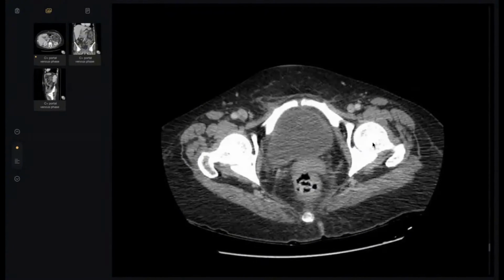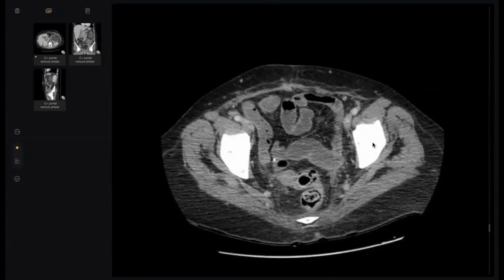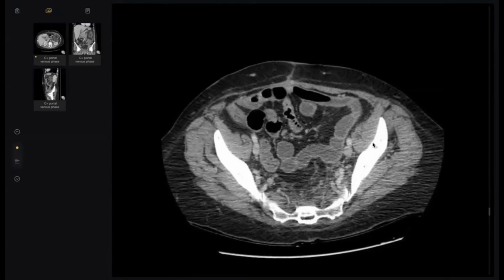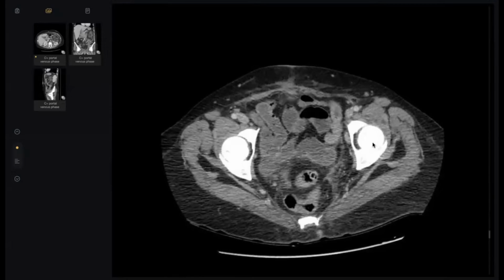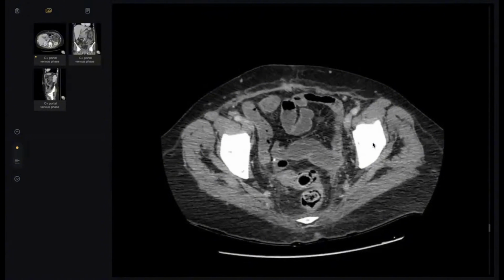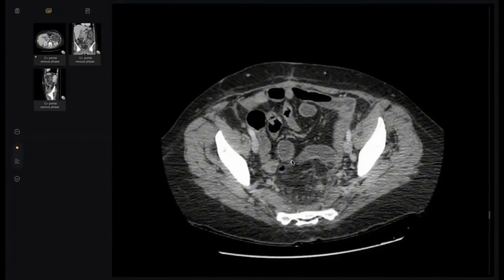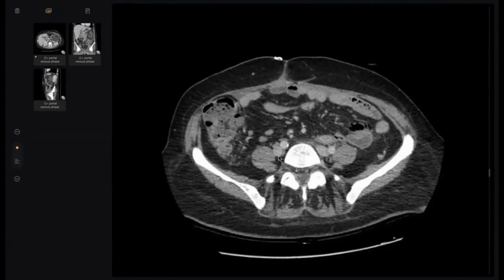Trace the colon, please. This is the rectum. I will go up this sigmoid. Again, this is the rectum. Up, up. What happened here? This is surgical clips. Can you see the rest of the colon? No, I can't.